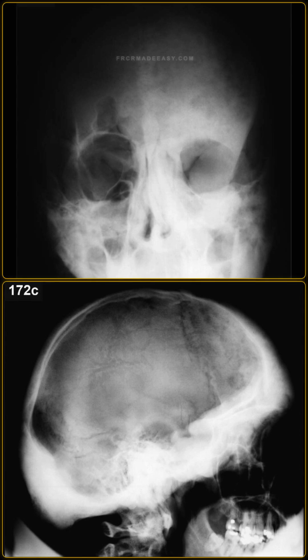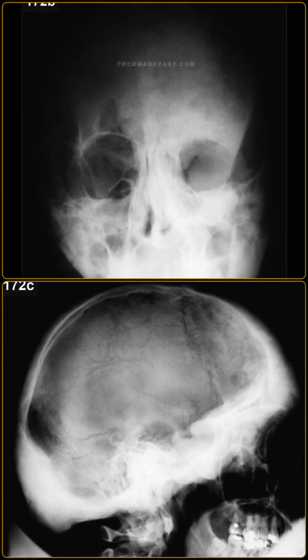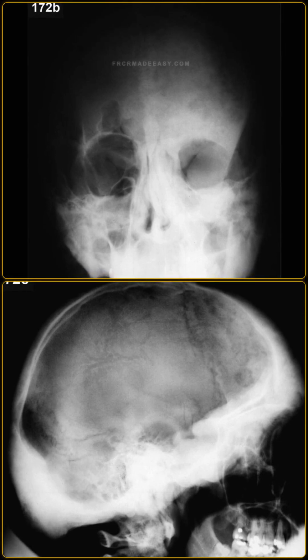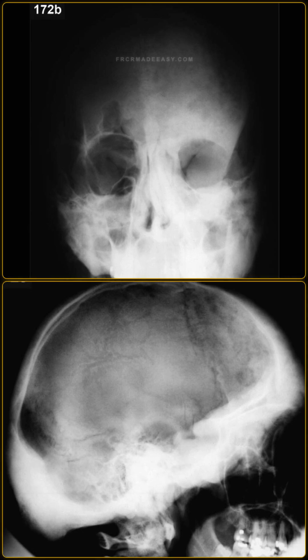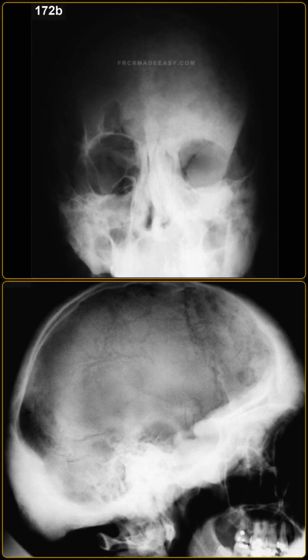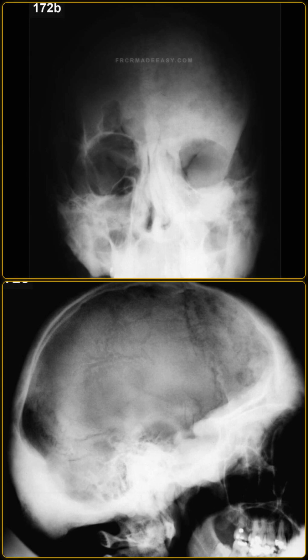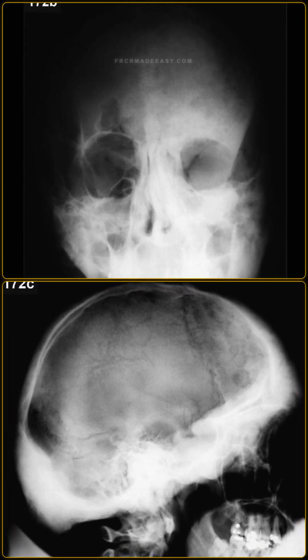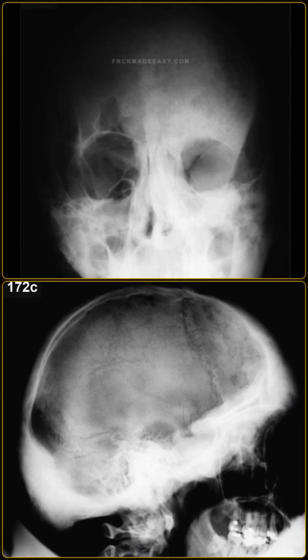I am showing you radiographs of the skull from a patient with a craniofacial variant. Describe the findings and name any associated clinical syndromes. These frontal and lateral skull radiographs show profound asymmetric hemicranial sclerosis and expansion of the calvaria, sphenoid, and facial bones. This craniofacial presentation of fibrous dysplasia is termed leontiasis ossea.